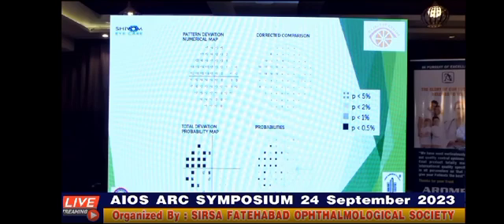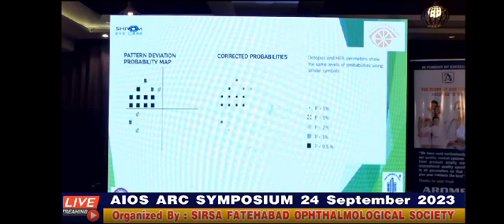The Octopus and Humphrey both use the same level of probabilities using similar symbols. Now, if we look here, the total deviation map gives us the total depression of the visual field, which includes the generalized loss as well as the focal loss. Now, since we are more interested in the focal loss, we should have a look at the comparisons and the corrected probabilities. This gives us the focal loss of the visual fields.